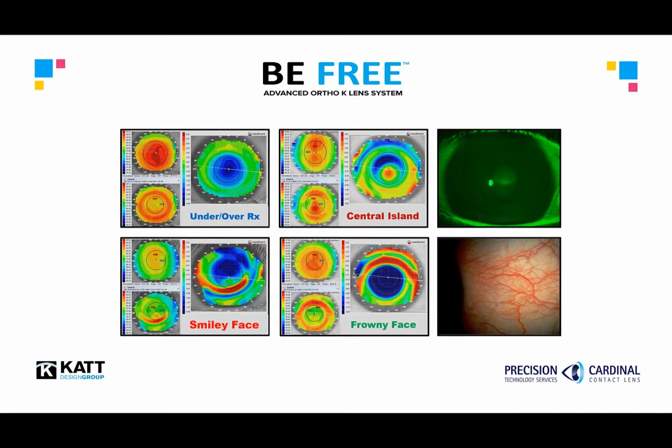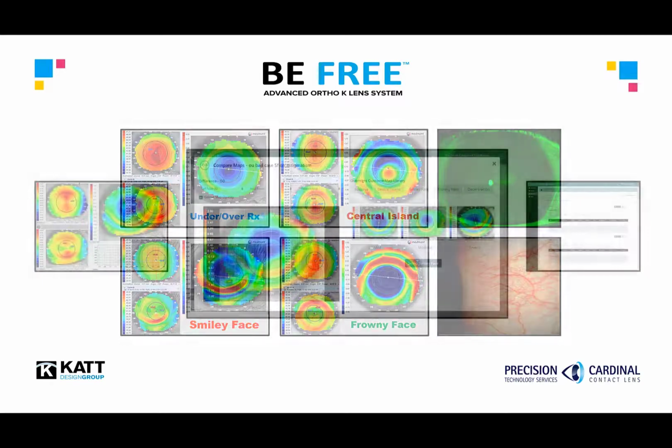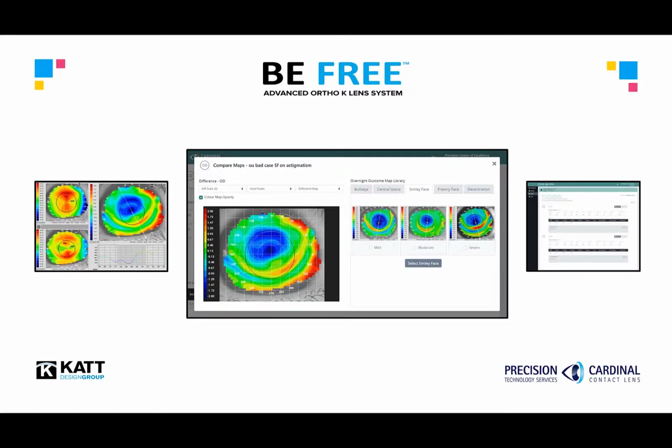The variety of responses to ortho-keratology can be fairly broad. Knowing what to modify when the lens undercorrects, or rides high, or produces staining can be a challenge, especially for the neophyte ortho-keratologist. The BeFree software was designed to simplify the entire process of analysis, lens modification, and processing.